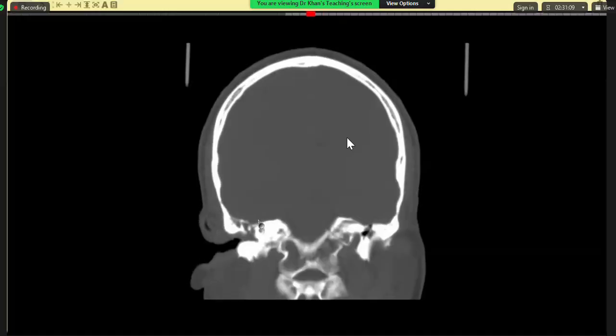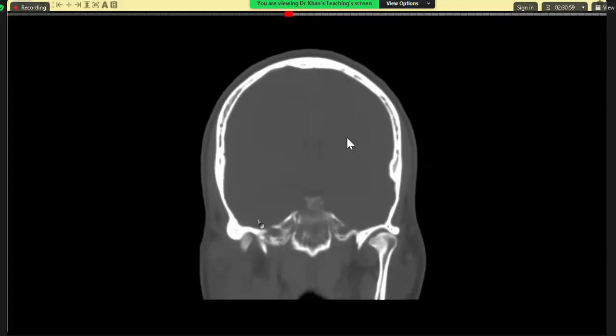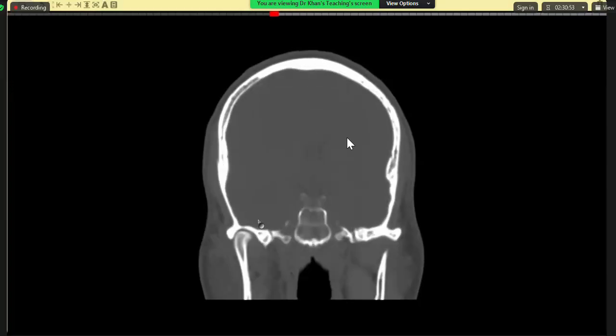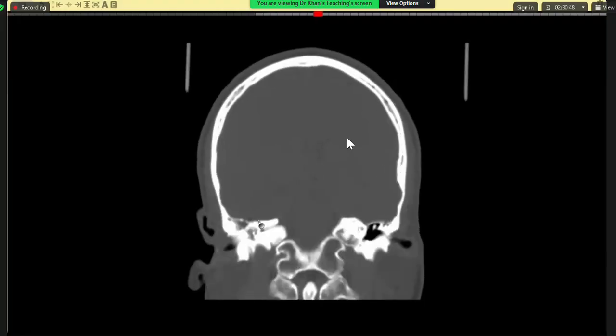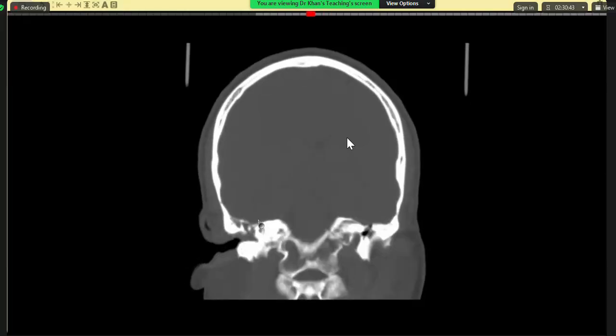So, it is likely acute middle ear infection with mastoiditis with extension into the brain parenchyma leading to a temporal lobe abscess with adjacent right sigmoid and transverse sinus thrombosis. I need to urgently inform the findings to the referring physician because I also suspected some uncal herniation at the same level. After the initial management is over, I will advise MR venography. But firstly, the patient needs to be treated urgently for this intracranial abscess and transverse sinus thrombosis.